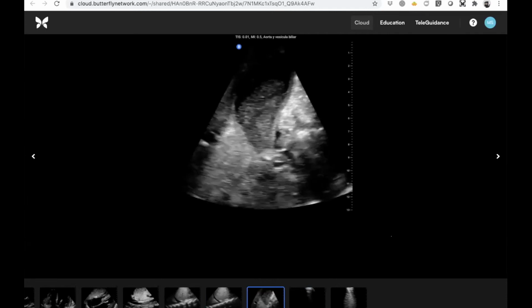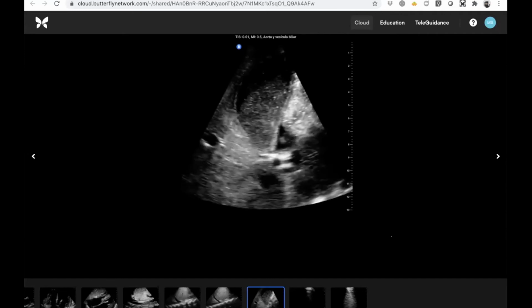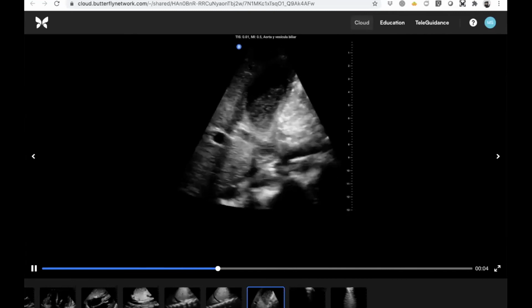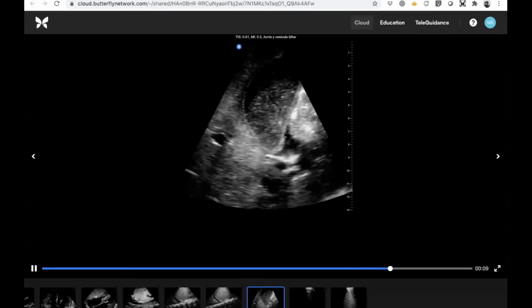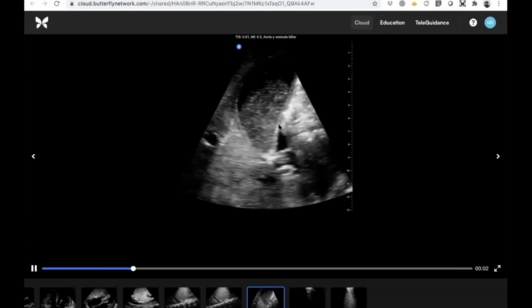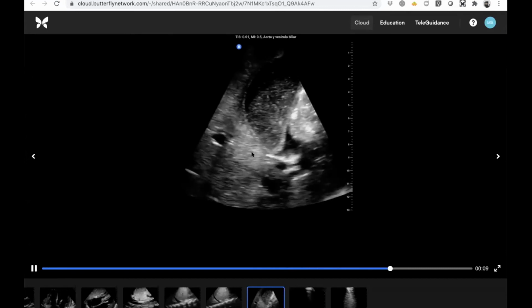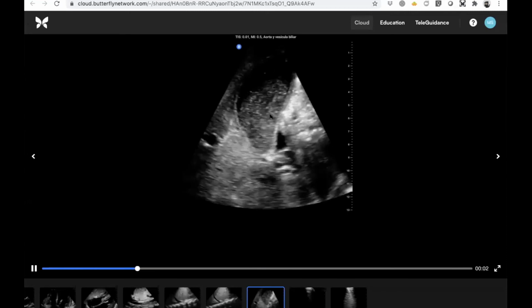And I thought this was a really great image. So we're in an aorta and gallbladder preset. We've got the gallbladder here, and there is some fluid outside the gallbladder, right? We've got this sort of anechoic, irregularly shaped fluid right here. It's got kind of spiky edges. It looks like free fluid right in there, filling in this potential space. So there is some ascites there, most likely. And we don't have a wall measurement or anything, but what do you think's going on inside the gallbladder?